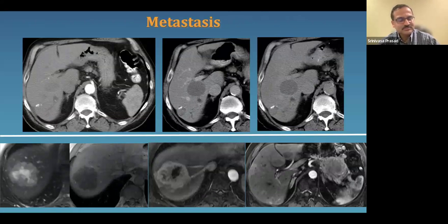Typically their metastases are multiple, and they are, for the most part, hypovascular. They can have calcifications, particularly if they are from the mucinous carcinomas of the gastrointestinal tract. They can be hypervascular. Typically they're heterogeneously enhancing nasty-looking masses. You typically have the hypervascular metastasis in the context of either thyroid, renal cell, or neuroendocrine primaries.